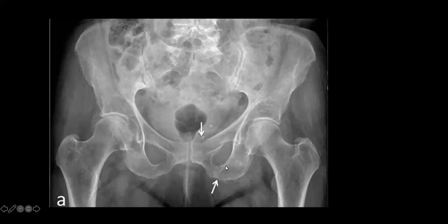As you may already know, the pelvis is a ring structure. So typically that means if it breaks in one place, it breaks in another. So if you imagine a polo, it's really difficult to crack a polo in one place. And for this reason, it means if you've seen one fracture, definitely keep your eyes peeled for another.